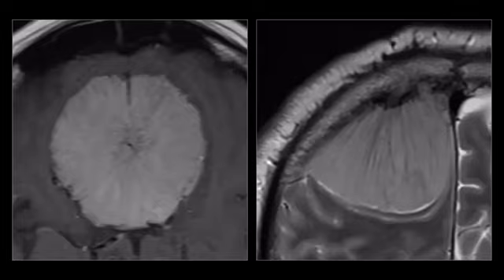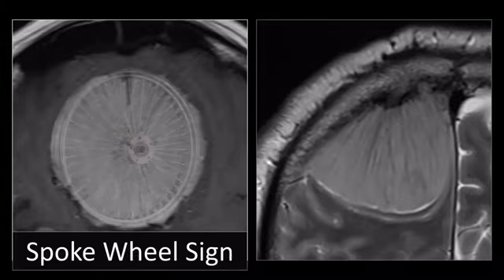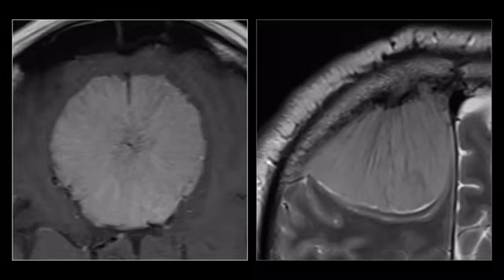Here are two additional signs that you can see in meningiomas. You rarely need those to make the diagnosis. There are a lot of other more defining characteristics, but these signs have proven useful to me in cases where there was doubt. And what are these signs? They have to do with these very small lines we can see extending from the center of the tumor to the periphery. And if we see that, we call it the spoke wheel sign.